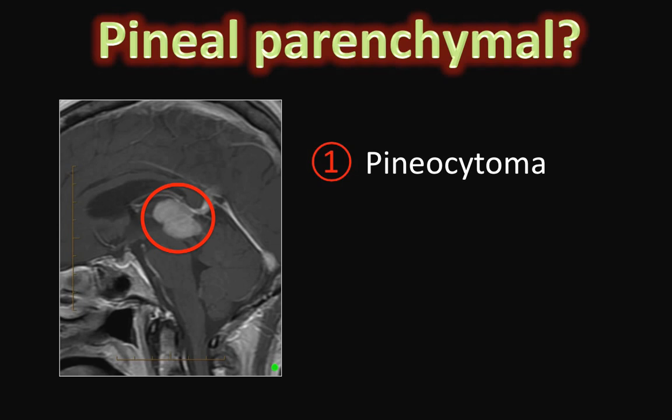This abnormality could have various appearances on MR. It could be homogeneous or heterogeneous, may contain cystic components, variously enhancing solid components, and calcifications. One important point of this lesion is that the calcifications, if seen, are usually exploded outwards, similar to what we saw in our case.